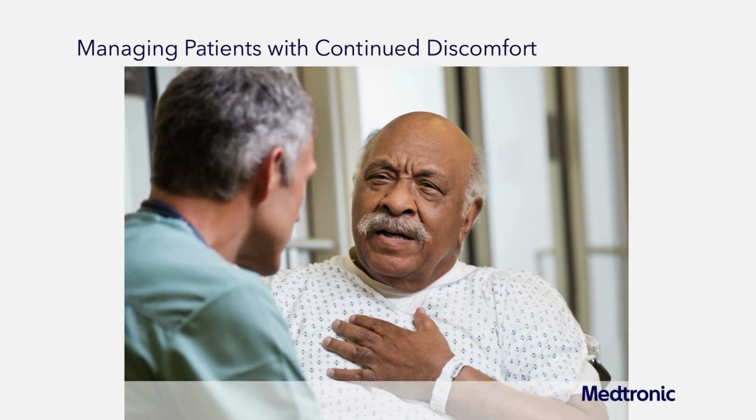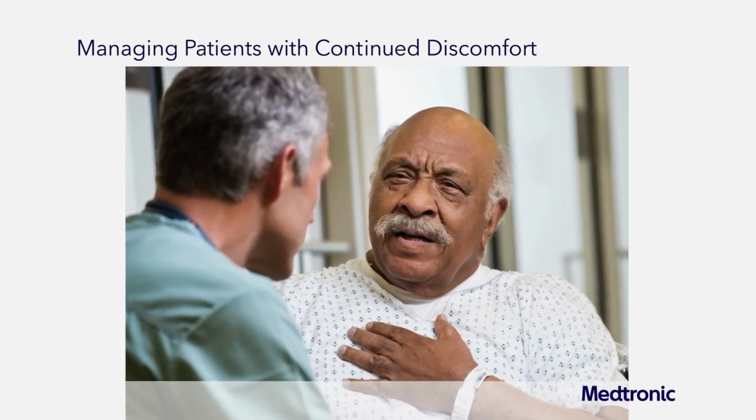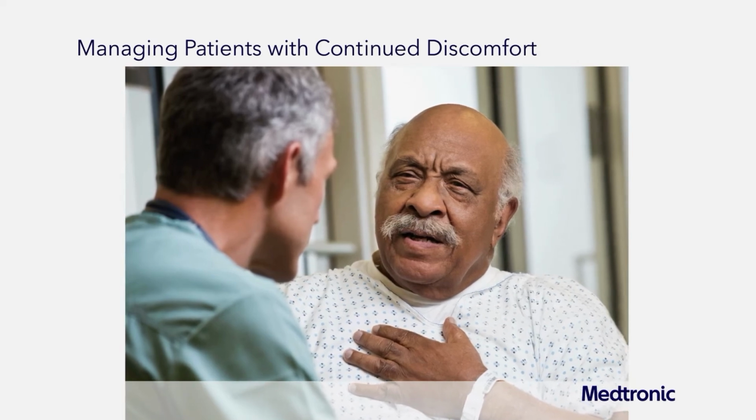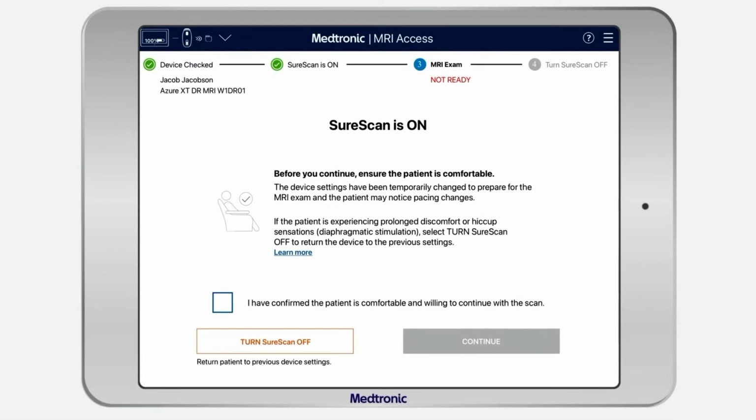Managing patients with continued discomfort. After SureScan mode is turned on, the patient may experience continued discomfort due to adjustments in their device settings. If this happens, do not proceed with the exam. Follow the appropriate actions to turn SureScan mode off. Your location in the MRI Access app workflow will determine how you turn SureScan mode off. Here are 4 workflow conditions for managing patients with discomfort and the actions to take for each.